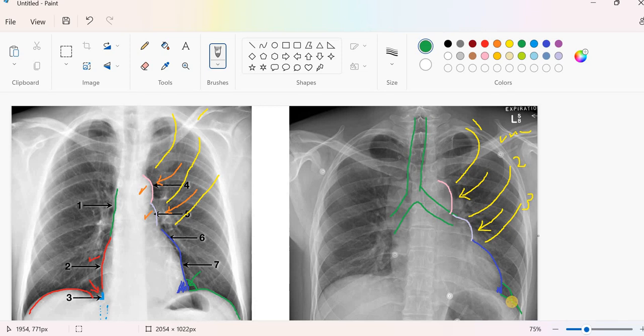That means the dominant chamber constituting the apex of the heart clinically is the left ventricle, and this is normal. Why? Because when we compare it later on, for example, with tetralogy of Fallot, it will not be the case, and the apex will be totally different in shape.